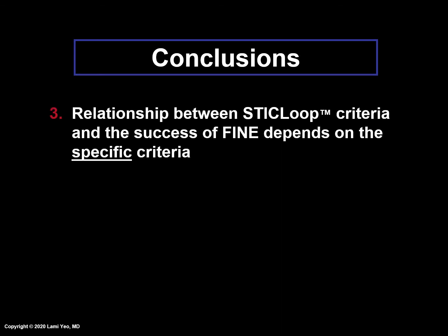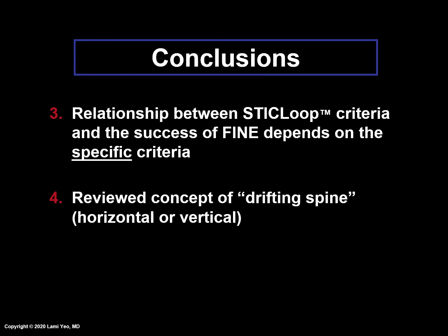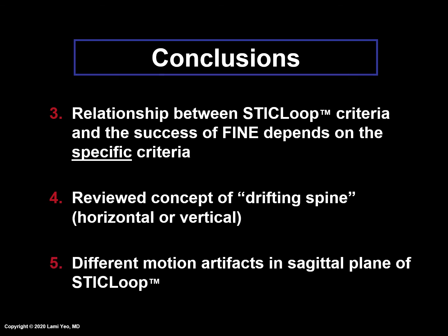The relationship between STICLoop criteria and the success of FINE depends on the specific criteria. We have reviewed the concept of a drifting spine, whether it is horizontal or vertical, and we have also reviewed the different motion artifacts in the sagittal plane of STICLoop.